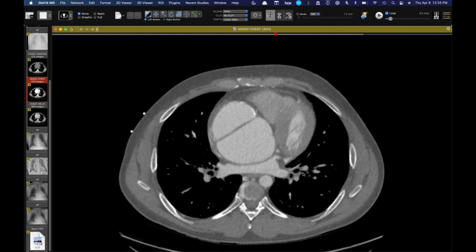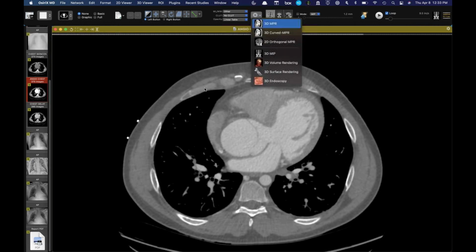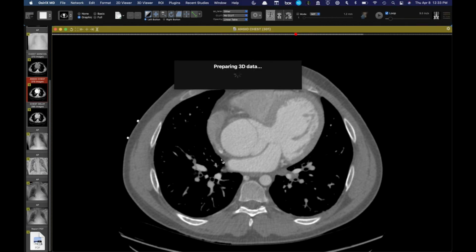I mean, is he marfanoid? They were evaluating him for that. They didn't comment on being bicuspid. Let me look really quick. Probably not. I'm just curious.